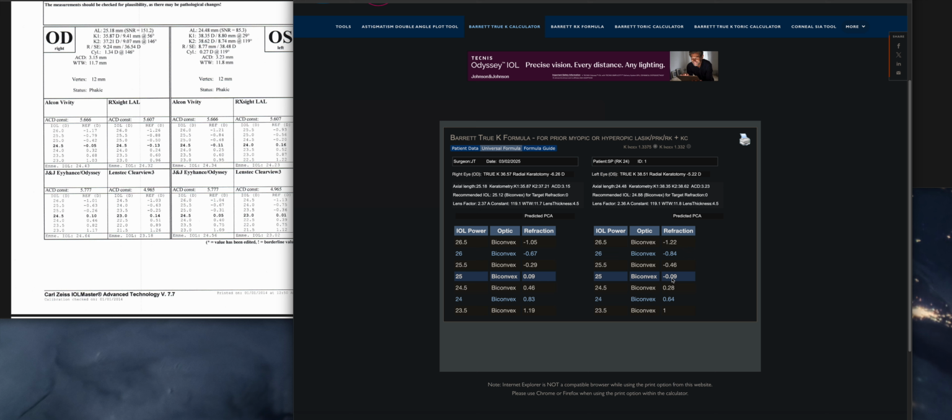I think for the sake of eventually being close to zero when she heals after 3 months, it's best to just select what this calculator tells you to, and not to account for it. We always get a 1 diopter hyperopic surprise with these calculators, and then we're going to target -1 to offset that. You can do that, but I don't usually do that.